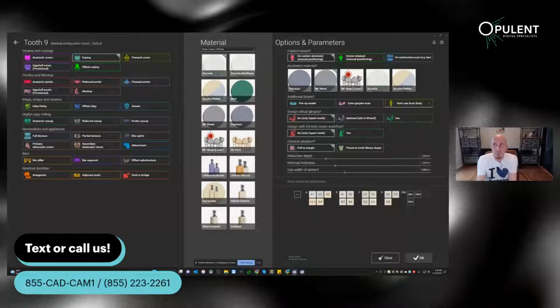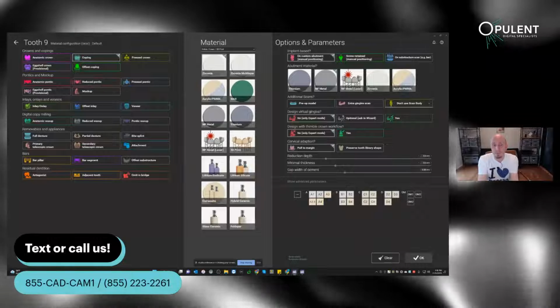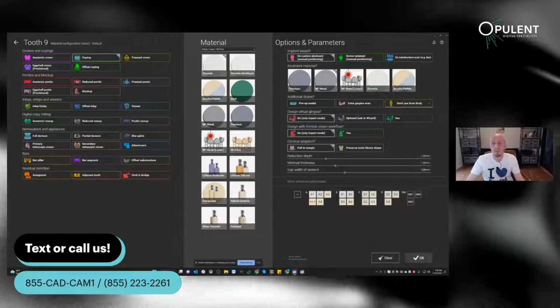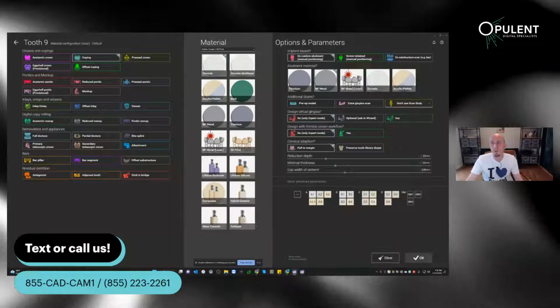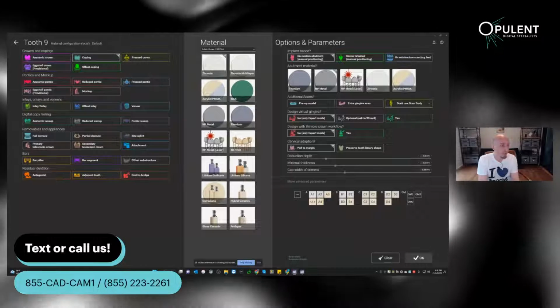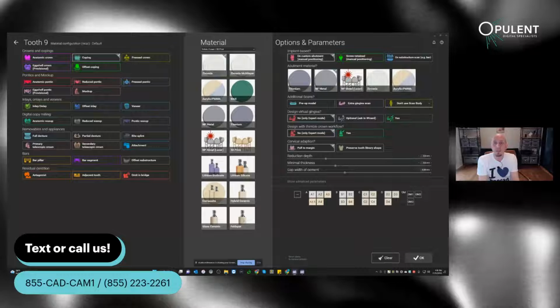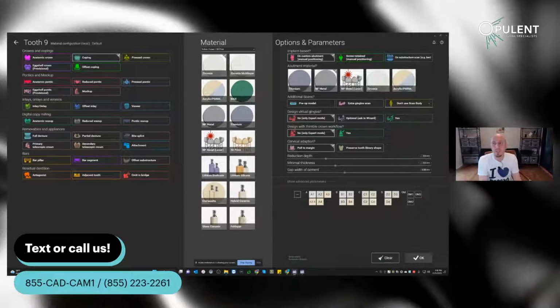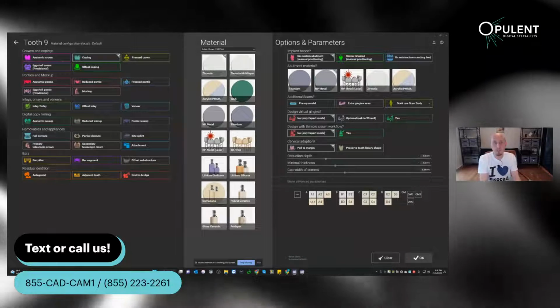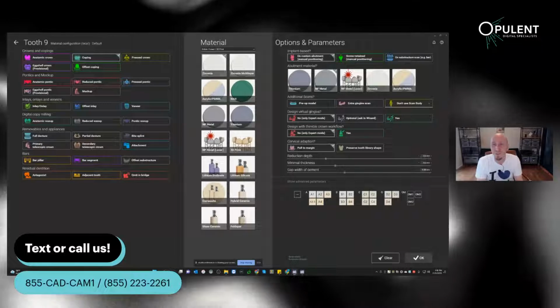So a good way of getting around this is basically treating your tie base like a crown and bridge case, if you want. And then don't use scan body here, use manual positioning as a way out, because now you get to grind on your tie base on the top only, of course. Don't grind on your connection geometry, please. But you get to modify it, adjust it to the point of what it needs. It's hopefully still structurally sound enough that it supports your case. And you spray it, you scan it, and use the manual positioning, and you call it a day, and it's Friday, and you get to go home into the weekend instead of working on a Saturday.